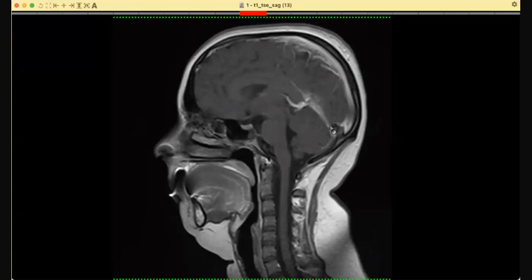So classically, whenever you see hemorrhage, particularly cortical, and it is not confined to a vascular, as in arterial, territory, think about venous sinus thrombosis.